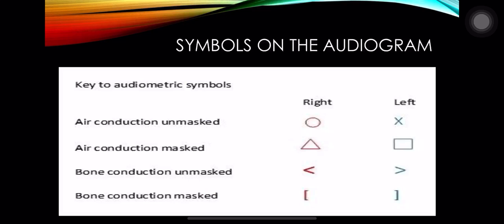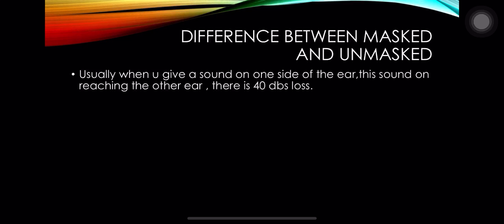Symbols on the audiogram. Before knowing the symbols on the audiogram, one must know what is an unmasked ear and what is a masked ear. Difference between masked and unmasked ear.